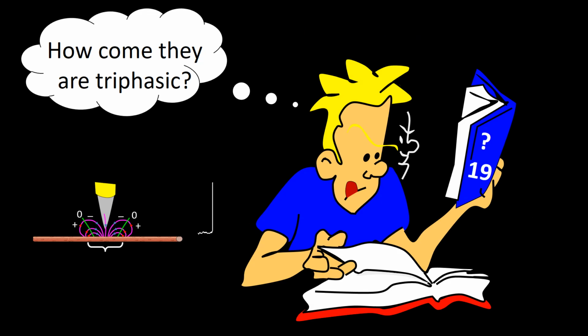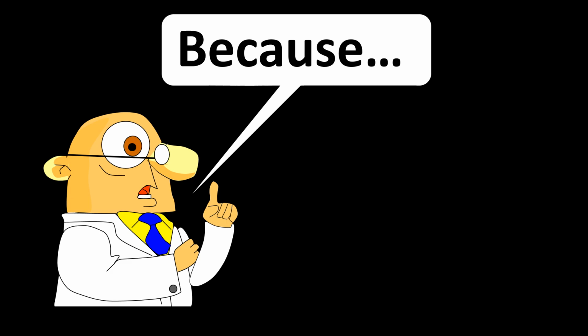Those of you that remember question 19 may ask how come the wave recorded at the end plate is triphasic and not biphasic with negative initiation, as we describe as characteristic of end plate potentials. I will explain why in the next few frames.